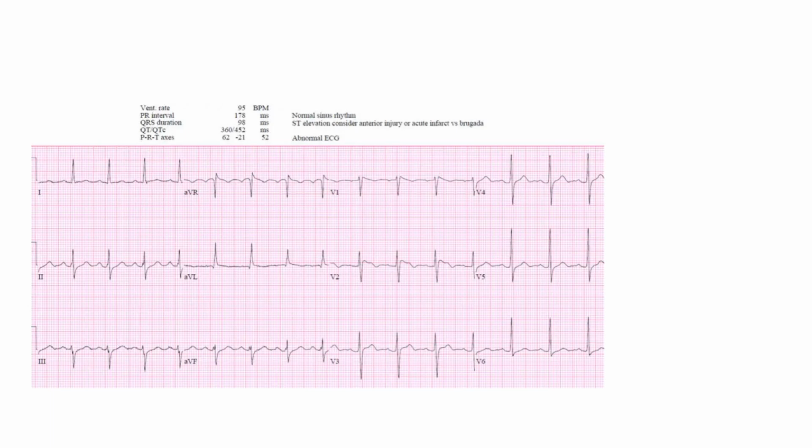Okay, here we have what looks like a Brugada's phenomenon, if I'm not mistaken. It could also be a TCA intoxication. We'll get back to that because that has a dominant R in AVL, in AVR. But it seems like it may be some Brugada phenomenon going on here, with maybe a type 2 Brugada with a saddleback kind of configuration here.